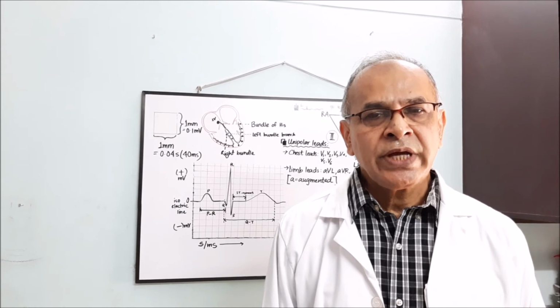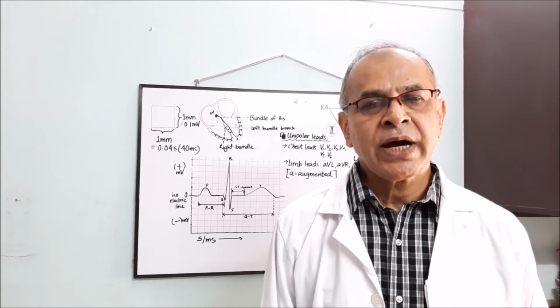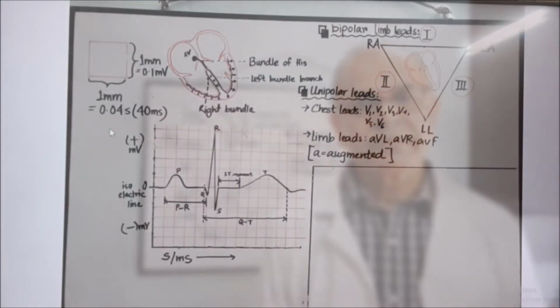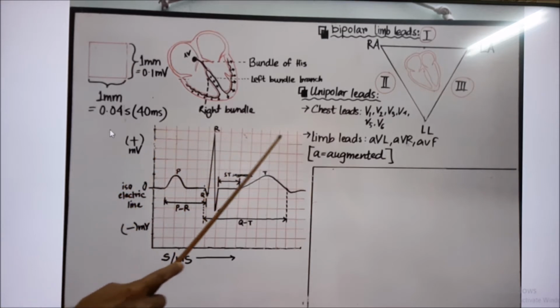Assalamu alaikum. Dear students, I am Dr. Abdul Sattar. Today I will give you some guidelines on how to draw an ECG and also how to interpret it. Now come to the main topic. This is an ECG paper.